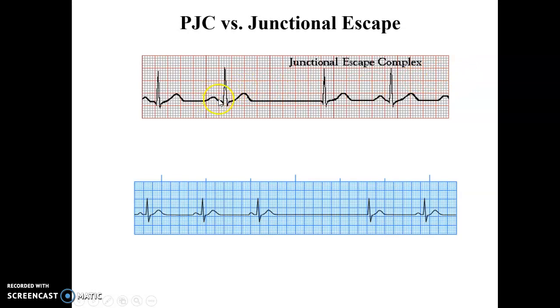They have a sinus P wave. PR interval looks a little long here. QRS looks like it's a normal size. And then it looks like I started to have a sinus pause. Well, what happens is your junction can kick in and say, hey, I'm not getting enough from the sinus node. My rate's gone too slow. So it starts to kick in as a backup system to help. And then the sinus node kicked back in on its own.